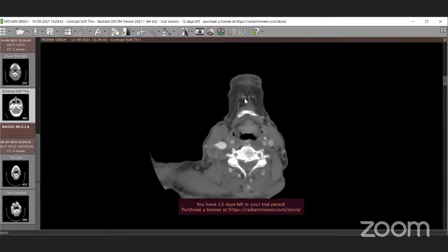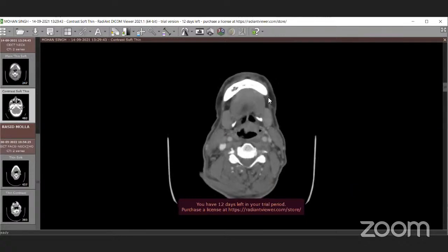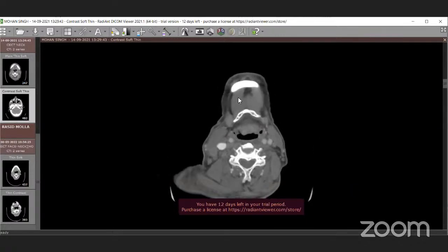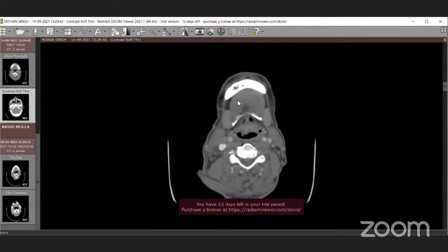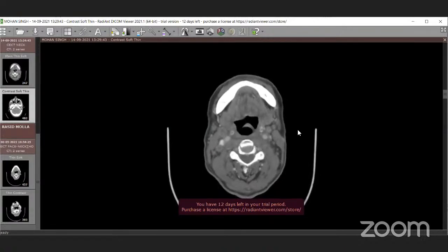Yes, sir. So next we move to, I think you have already shown us the mylohyoid muscle here. Could you please show us these things? This thin muscle here is the mylohyoid muscle, the thin muscle on either side. And this is the big fat muscle, the anterior belly of the digastric. This is the mylohyoid here. And next, always try to, in the sagittal section.